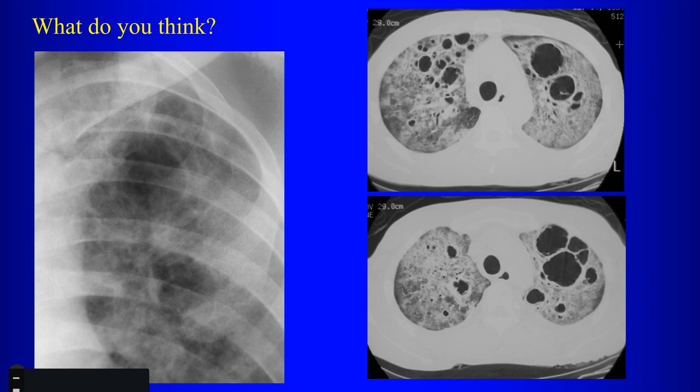So here we have this particular appearance. What underlying disease would this patient have? ARDS. Well, you suggest ARDS because you have what? You have ground glass consolidations and you have pneumatoceles. In this hospital, though, there might be one thing I would suggest before ARDS in a patient with pneumatoceles and ground glass opacity. What? Pneumocystis pneumonia, yeah. So it'd be important to know if the patient's HIV positive. But pneumocystis infection is notorious for giving you pneumatoceles. Okay, so pneumocystis is an infection that can be associated with pneumatoceles.